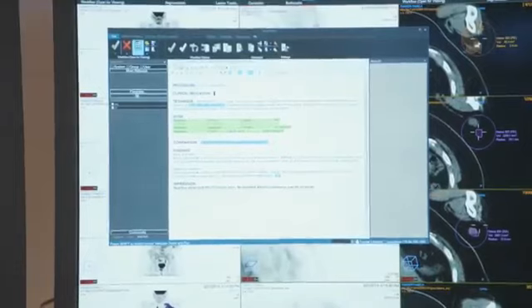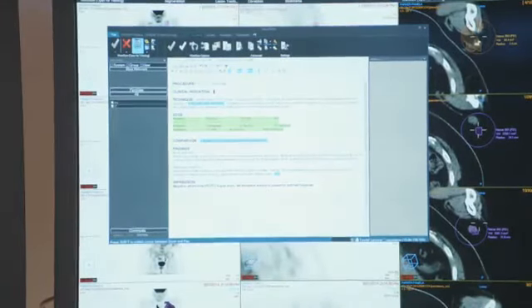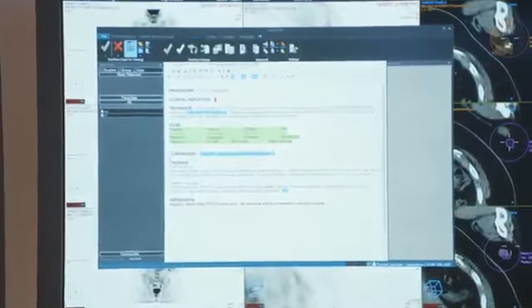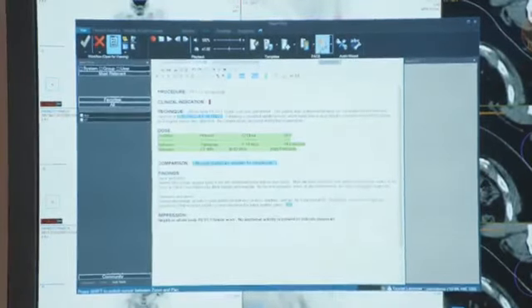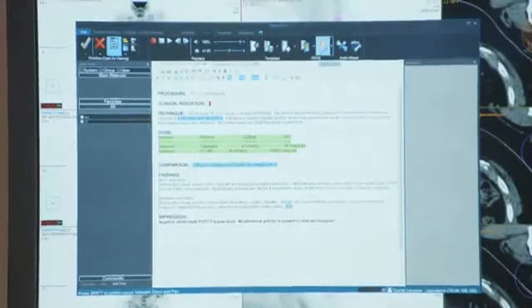I'll add key images, and this will minimize the risk of any error within this process, directly taking all the measurements into our report. So I'll do it now. Okay, so I've opened my report, and basically what I'd like to say is that no progression was evident, but what I'll show you is that using copy analysis, we can insert the measurements directly into our native reporting.